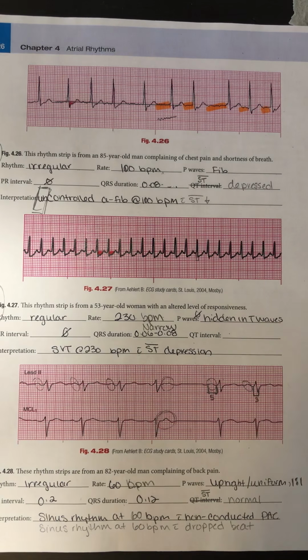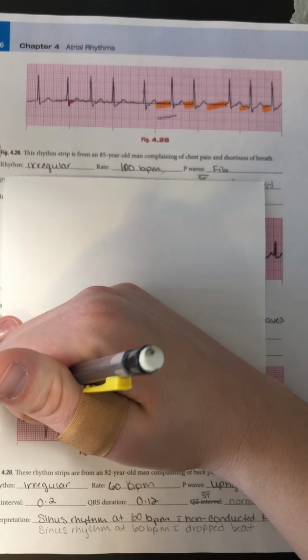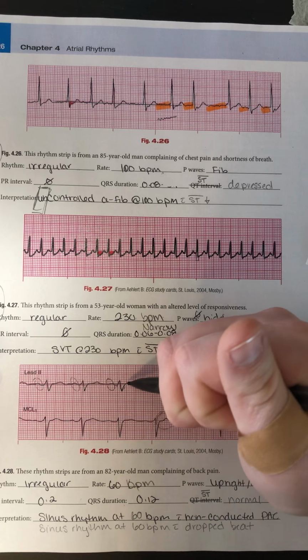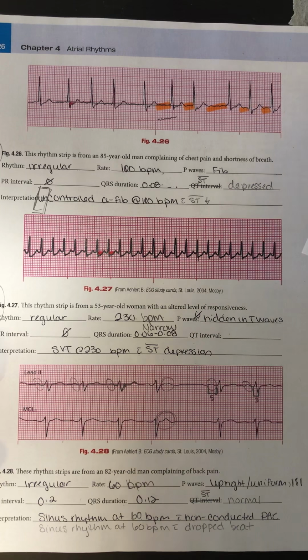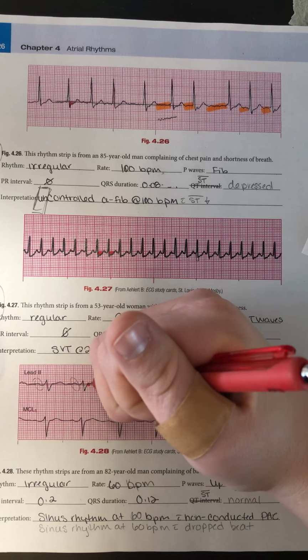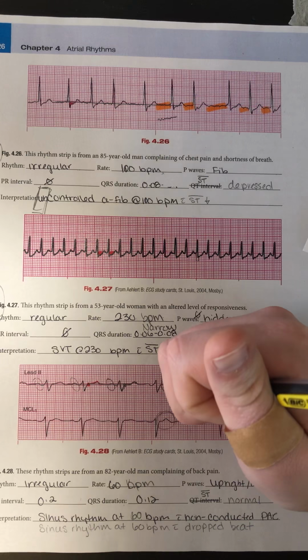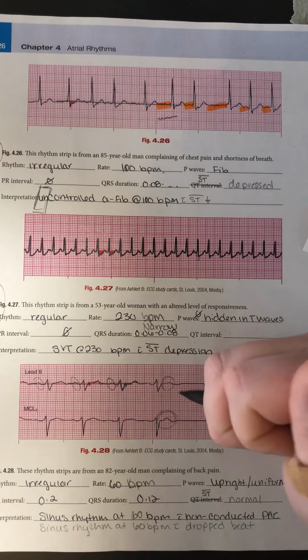My ST segment in this rhythm is normal. So I have my QRS, my J point is up here where the segment goes into the T wave. So the J point's right here where the QRS complex ends and goes right into the T wave, so it remains right on the isoelectric line. Now, what makes this rhythm difficult is right here, it's very hard to see, but we actually have a P wave that we do not have a QRS that follows.